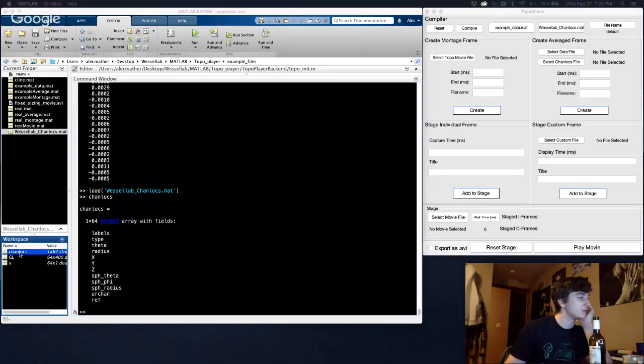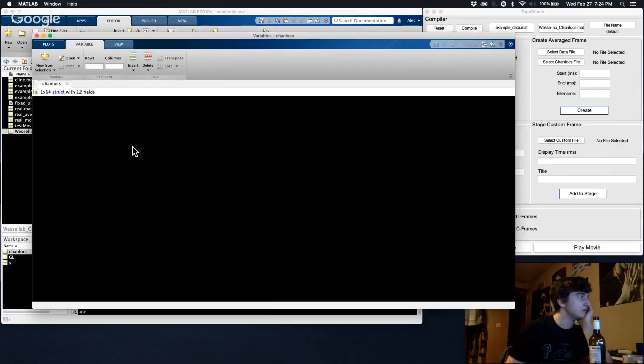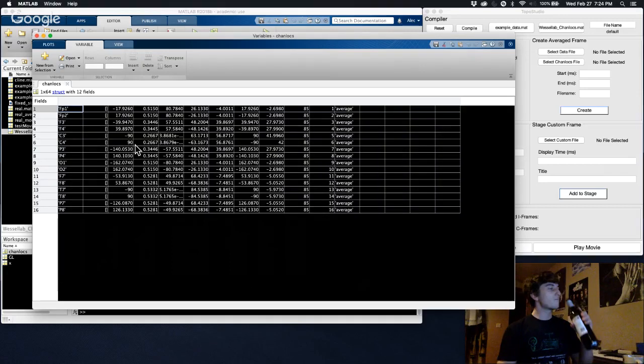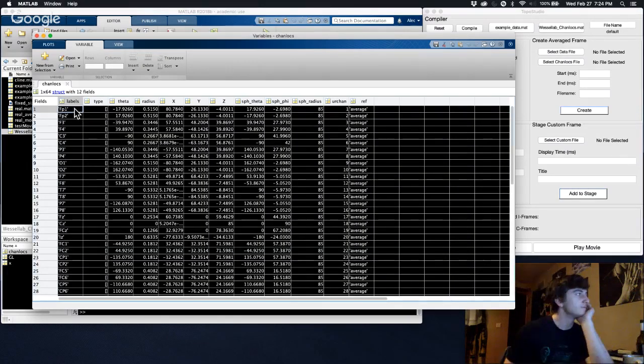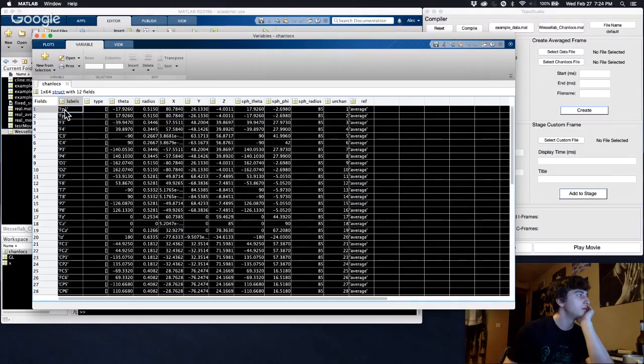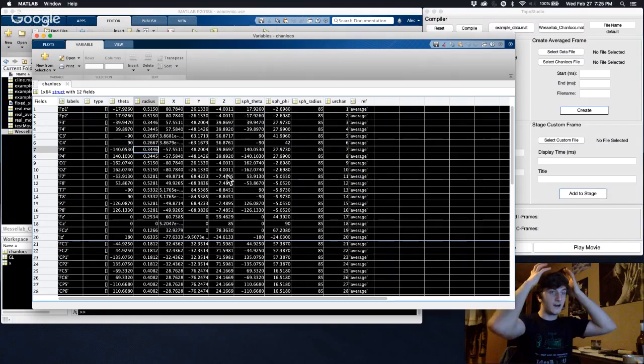I don't really know what's in here, to be honest. I just know that we need it in order to plot data on a topographical map. It has information like FP1, FP2, which are the channel names, and then coordinates of where they are on your head, like on the heat map.